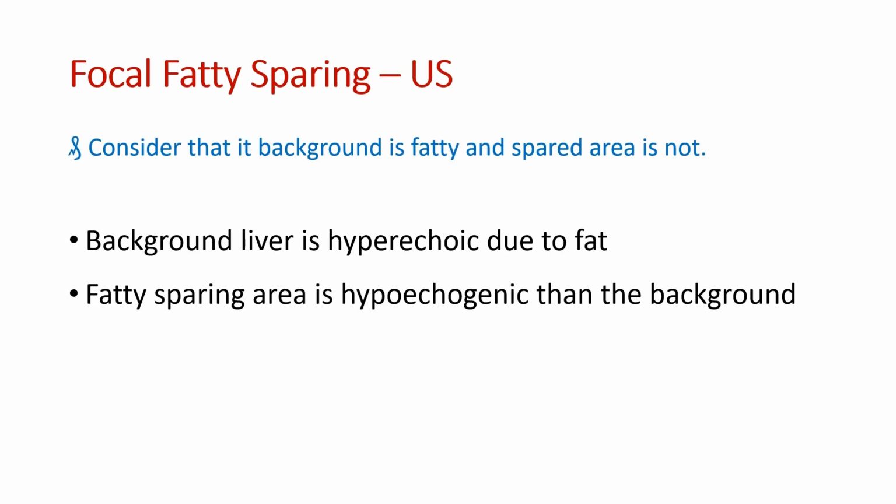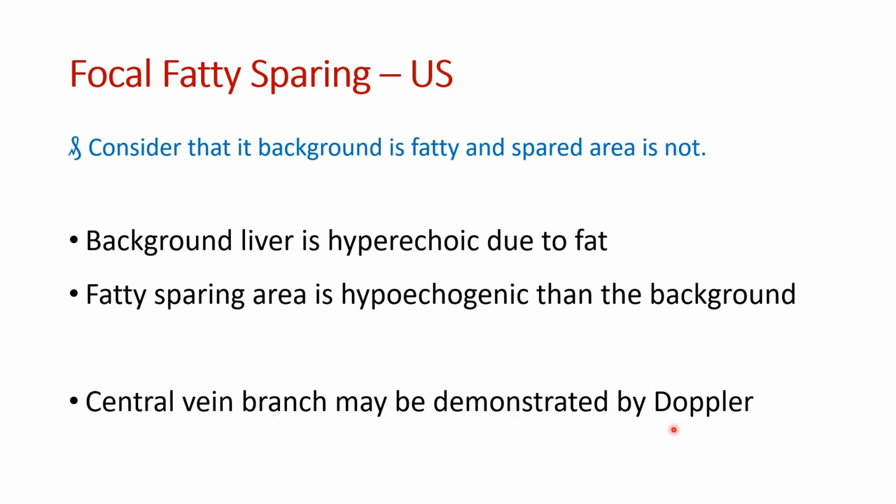In ultrasound, we should consider that the background is fatty and the spared area is not. That's why the background liver is hyperechogenic due to fat, and sparing areas appear hypoechogenic relative to the background parenchyma. Central vein may be demonstrated by Doppler imaging.